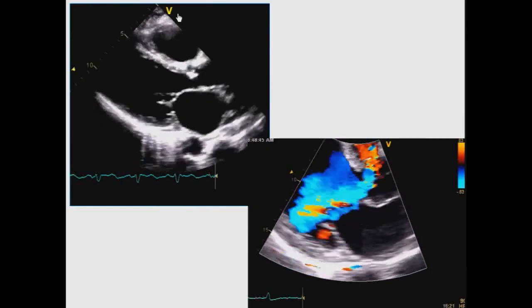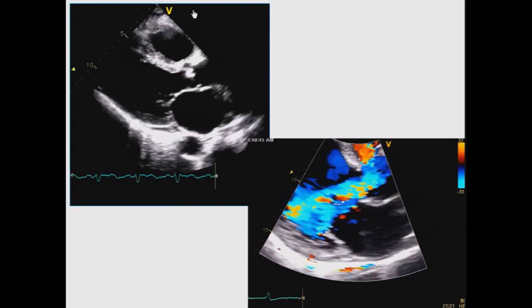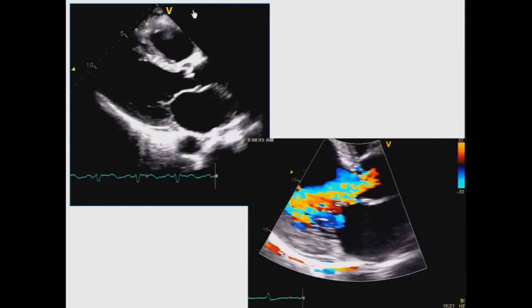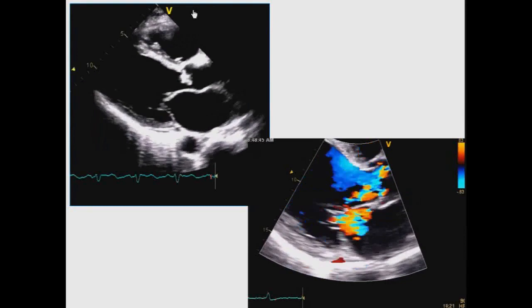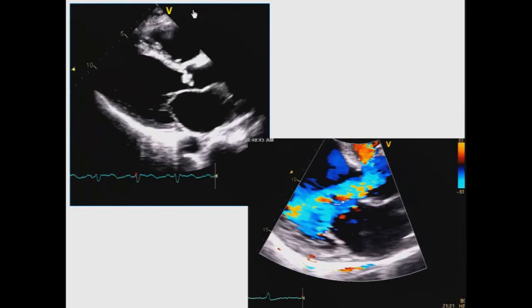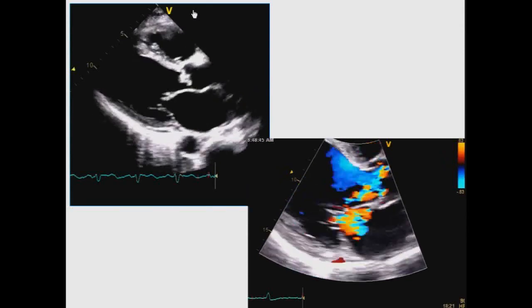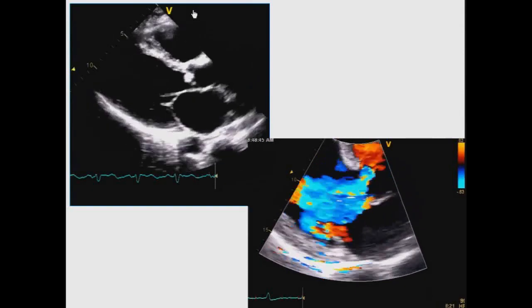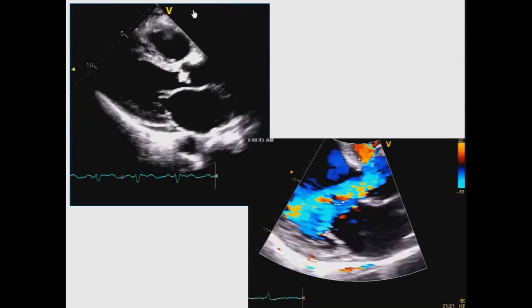It turns out that fat located below the visceral pericardium does track with visceral fat elsewhere in the body and the metabolic syndrome. And in my personal observation, as we're imaging older and older patients, that degree of fat does seem to be increasing, even in people who don't have a lot of abdominal obesity or fat elsewhere.